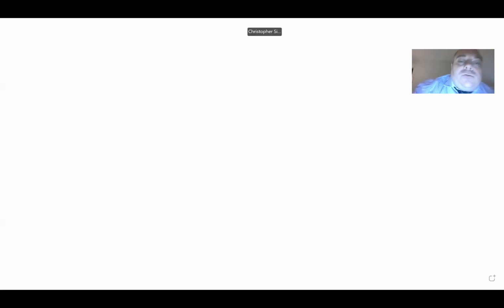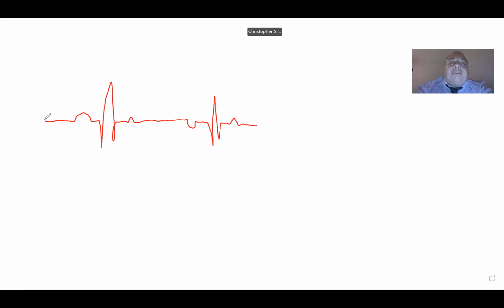Let's draw it. I'm not going to tell you. It'll be a surprise. Do my best to draw now. So P wave, QRS, T, upside down P wave, QRS, T, wizard hat P wave, QRS, T, artifact, wizard hat, QRS, T, upside down one, QRS, T.